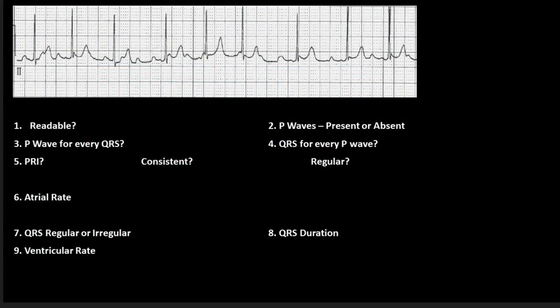All right, in today's edition of the ECG step-by-step, yes, I forgot what it was called, we are going to take a look at a multifocal atrial tachycardia. If you have not watched the video for a wandering atrial pacemaker, I highly suggest that you do that first, because essentially the rules are the same, but the difference here will be the rate. So let's dive in and take a look at some things.